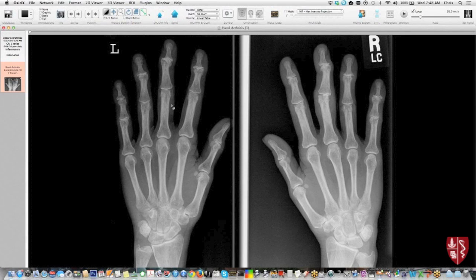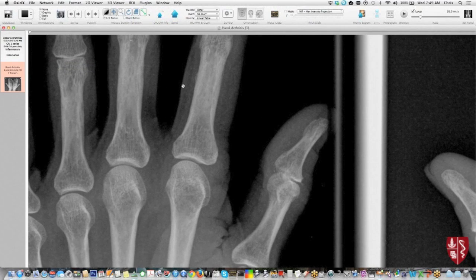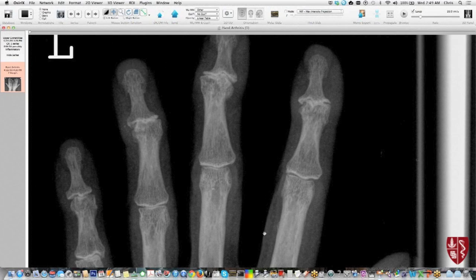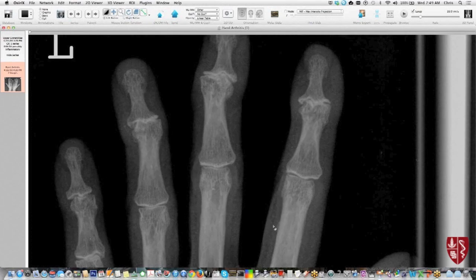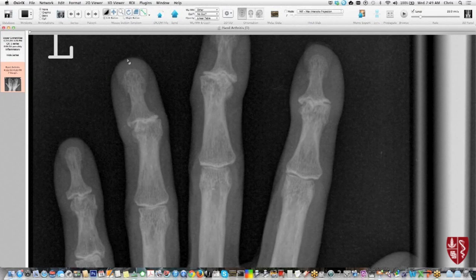One other case here that's probably inflammatory osteoarthritis, and so there is a little bit of an imaging overlap, although the erosions in this situation are not as dramatic by any means as the true inflammatory arthropathy. So again, looks very similar to the other case I showed, but you can see that there's kind of this gull wing appearance here to this DIP joint. A lot of narrowing, looks like typical OA here. All right.